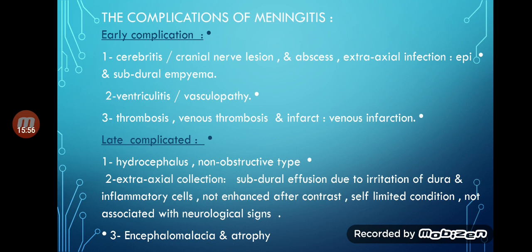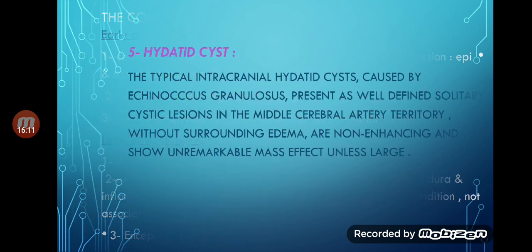This is significantly of no clinical effect, it does not affect the patient. Late, it develops into encephalomalacia. Encephalomalacia means atrophy of the brain. Encephalomalacia, atrophy of the brain. This is a complication of meningitis.